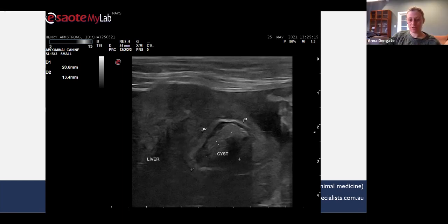So this is a picture of the left liver lobe. The structure in there is definitely not gallbladder. So this is a situation where we're not just describing the liver. We've talked about the echo texture and echogenicity of this liver. We can't really comment on size. Now let's talk about how we define nodular lesions within the liver. So does anyone want to have a crack at describing this structure?